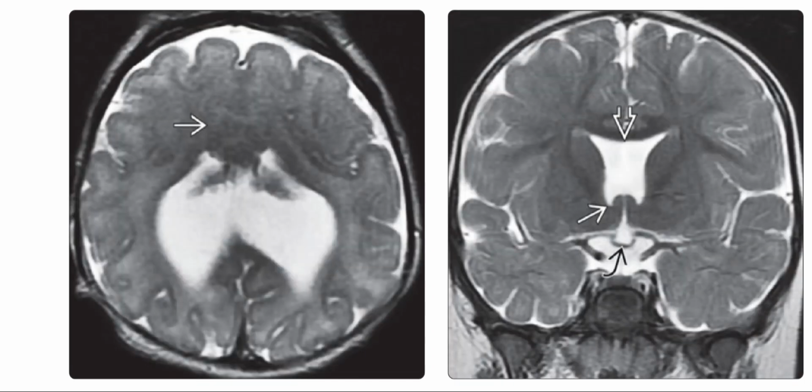In these images, we can see that the image on the left is the axial T2 weighted MRI, and it allows analysis of the midline and shows absent interhemispheric fissure in the frontal lobes. The white matter is continuous across the midline. This finding, plus the absence of frontal horns, gives the diagnosis of holoprosencephaly.